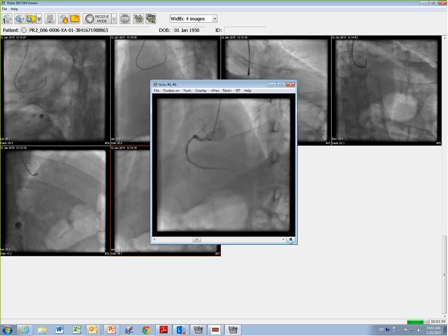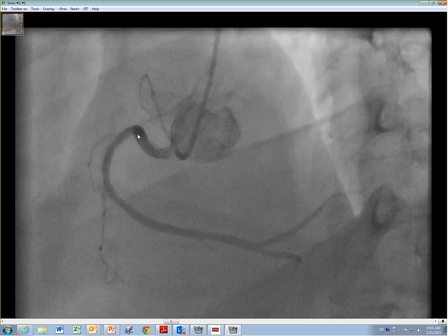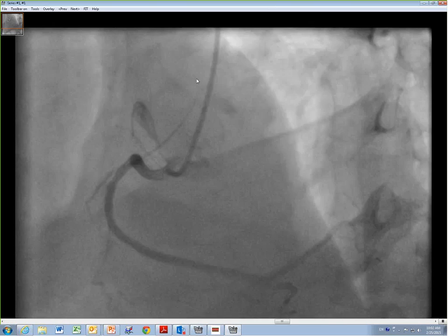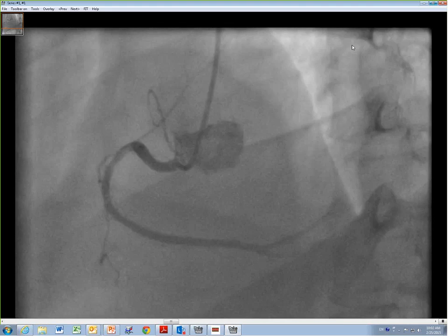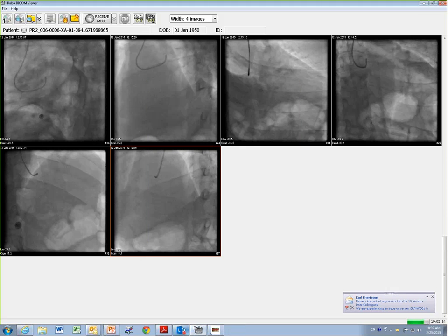So this is how it looks. Quite tortuous and big. And quite interesting for me, because when I see this picture, actually this was significant, but angiographically not too much. No, I totally agree. Yeah. Okay, so let's open the IDAS.